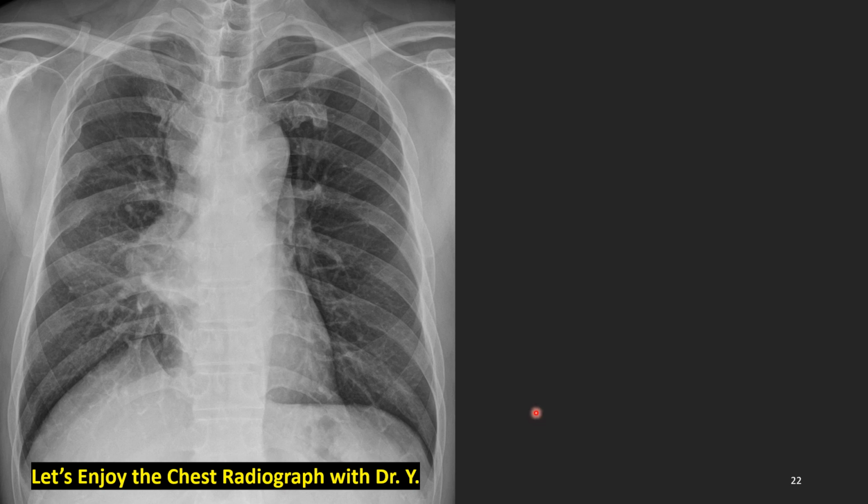Let's look at this old man's chest PA frontal film. Large bulging mass, broad-based on the mediastinal side, well-defined margin, obtuse angle, right paratracheal stripe obliteration. What is this? Where is it now? You can imagine. Visceral compartment.